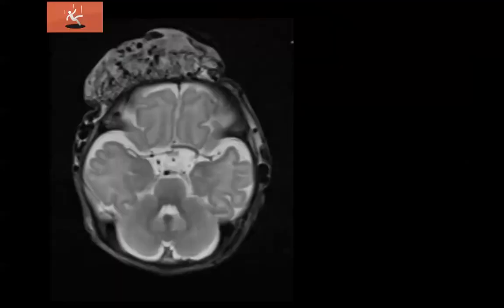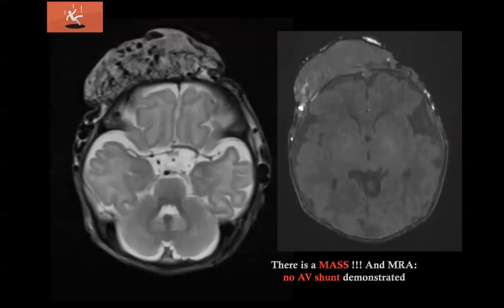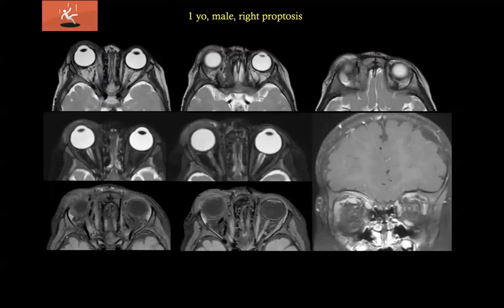Well, there is a large mass full of flow voids without any shunt demonstrated. So when there is a mass with flow voids, the key radiological finding, flow voids, it is the same for hemangioma and AVM. Shift your differential toward a hemangioma, which will never have a nidus or AV shunt visible, and will have a mass. Okay, so when you see mass and flow voids, think hemangioma.